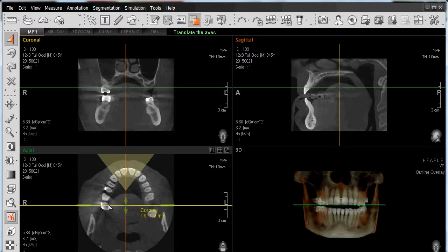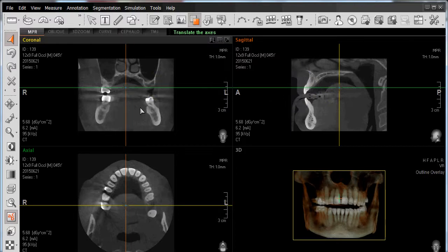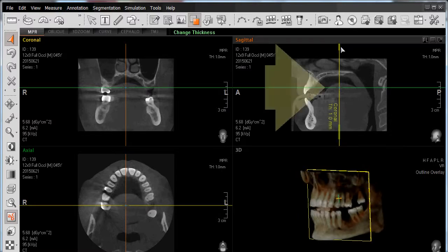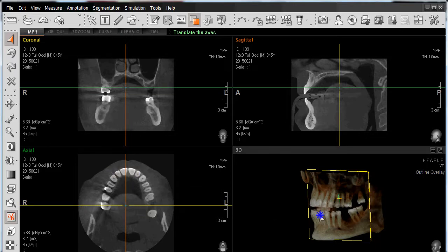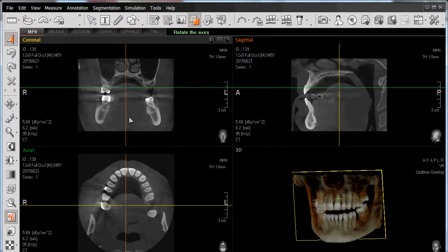In this case, this coronal line here, as well as this coronal line over here, are generating the view in my coronal window. To see that, I'll rotate my image around, and you'll see that this line going from superior to the inferior border of my scan is this line from here down to there. The line going from right to left is then this line going from right to left. This is what is then creating our view in our coronal window.